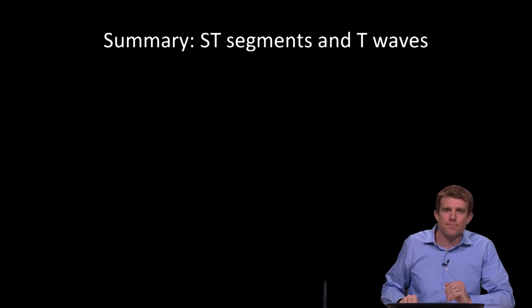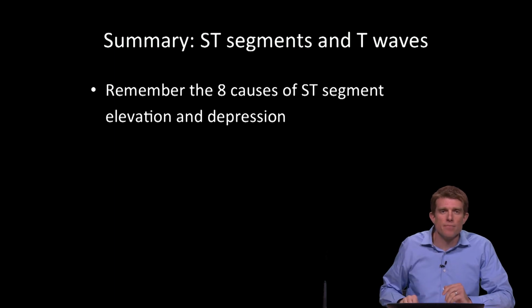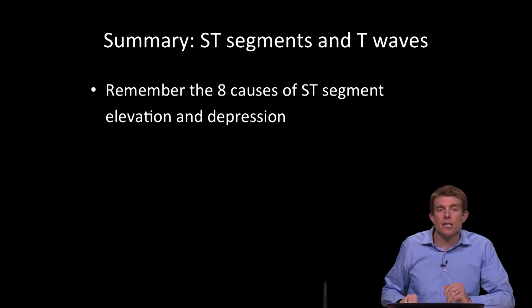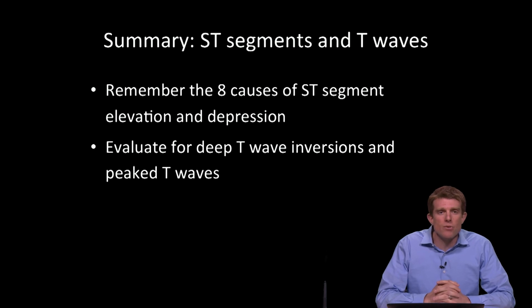So in summary, our ST segments and T waves. We want to remember the differential diagnosis and our 8 causes of an ST segment elevation and depression. And then we want to look for those deep symmetric T waves or peaked T waves.